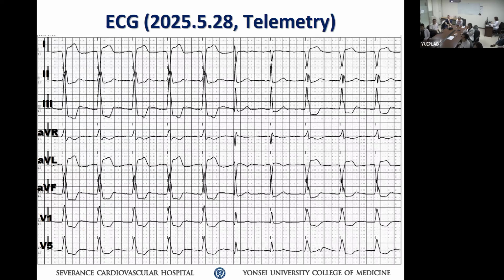At the time, I could not differentiate it between a pacing rhythm versus slow VT. But the 12-lead during pacing has exactly the same axis. This is the pacemaker rhythm that we saw. This is AIVR, and it's not a VT. So there's no real indication to ablate or anything crazy like that.